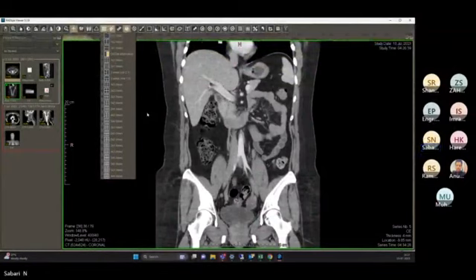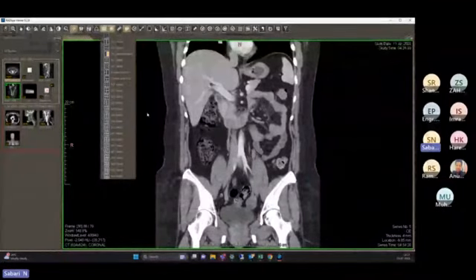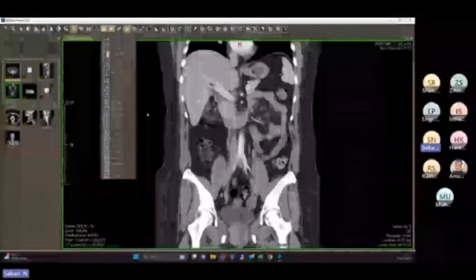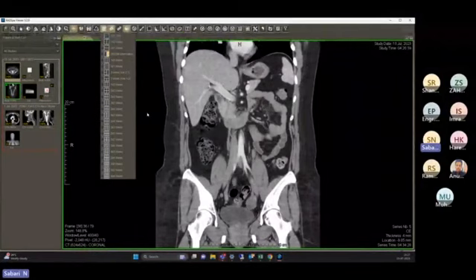So that is the reason PACS is used, because PACS is basically an archive system. From the modality, the scan is pushed to the PACS system. According to your caseload and the storage availability, you can store the data for 3 years or 5 years or 7 years, because the same patient can come anytime. Today I did the scan, maybe the patient can come after 3 years. So if you have a PACS system and you open today's scan, the scan from 3 years before will also come automatically, showing as a prior, the current and prior, the older scan.